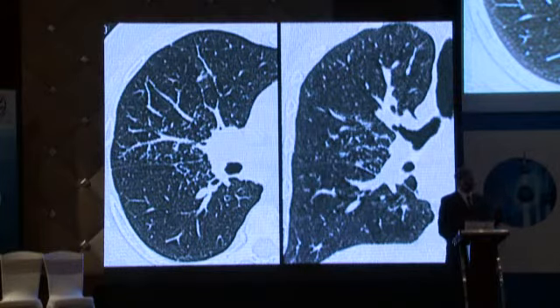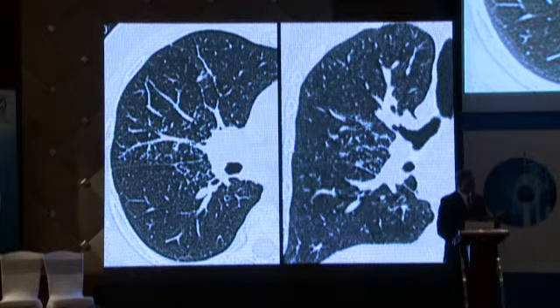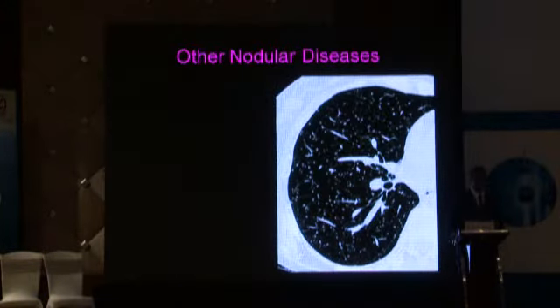When sarcoidosis presents initially, or when we see the early lung findings, they're always perihilar. You see the major fissure involved just next to the hilum, and we may get just one vessel that shows perivascular beading. On the coronal images, especially if we have a 64-slice scanner or higher, we can get these isotropic images that show the fissural nodules that much better. We should be able to differentiate these nodules from other nodular diseases.